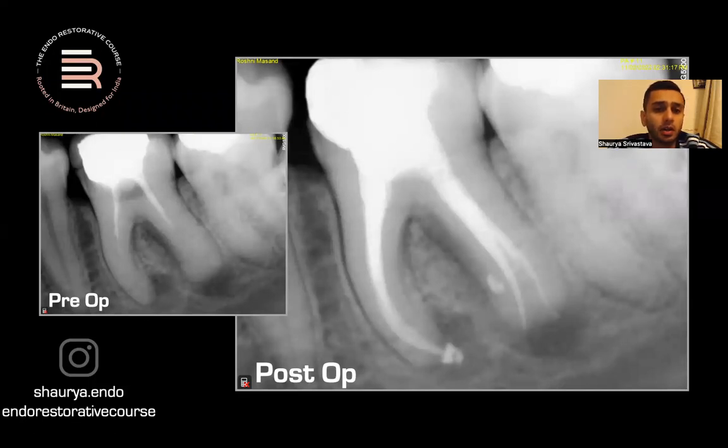But yeah, if I did not have a CBCT here, we may talk about, okay, this looks lovely, etc. But had I not had a CBCT here, I'd not have got half of the outcome that we see over here. So it's all about your pre-endodontic evaluation, optimizing your CBCT well enough, but also looking at a radiograph well too, to refer the patient to get a scan done. Because if you can't read a 2D image well enough, you will not be able to optimize or refer the patient for a scan, because you're missing out so much information. So you won't know when to refer or not.